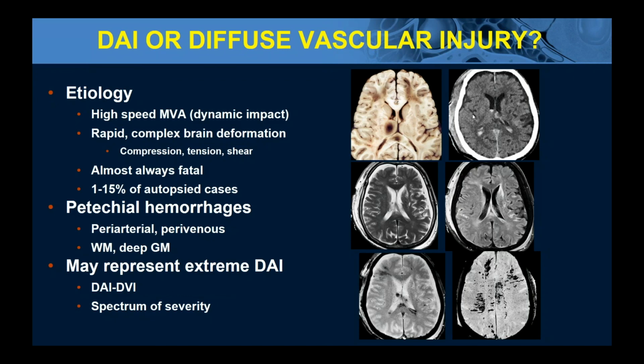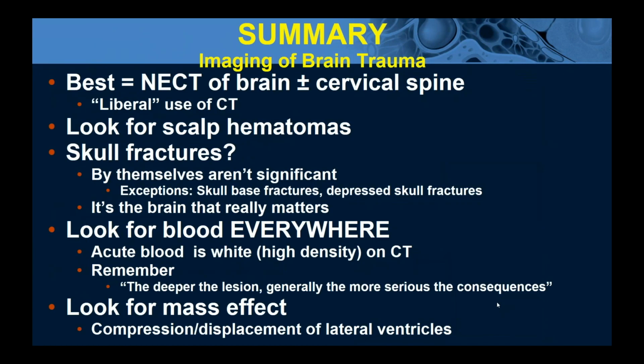Look how little you see on the CT scan. Some traumatic subarachnoid hemorrhage, a little intraventricular hemorrhage, the T2 weighted MR scan. These don't look too bad, but if we do a special scan that can show brain bruising and blood, you can just see them all over the place. And that's diffuse axonal injury.